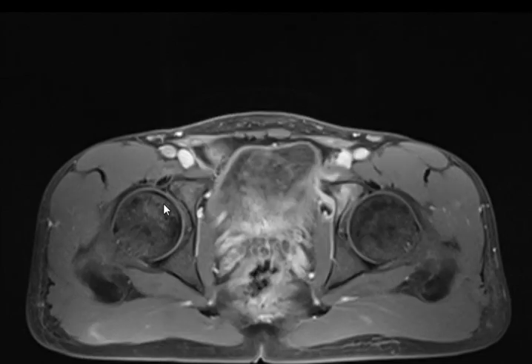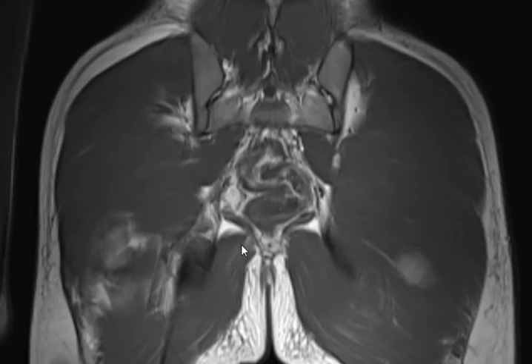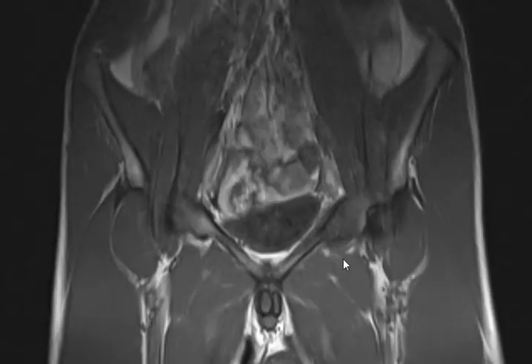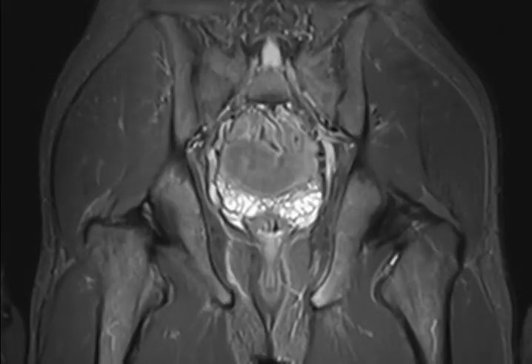Good. Let's see if there is any coronal image. No, I don't have any X-ray. Sorry. Do we have a coronal or something? Let's see here. This is without contrast, but let's see on coronal. So first of all, we have a pathology here. It's expanding the bone. Exactly. And we have something else here. See, this is the normal, this is the abnormal. Let's go on the coronal T2 fat sat.